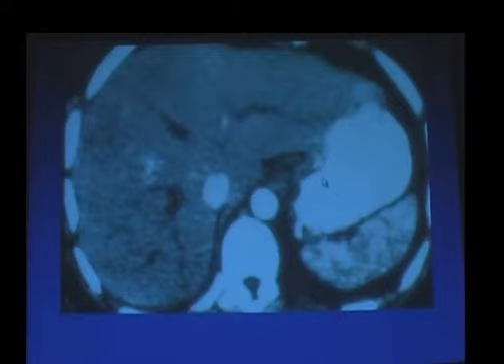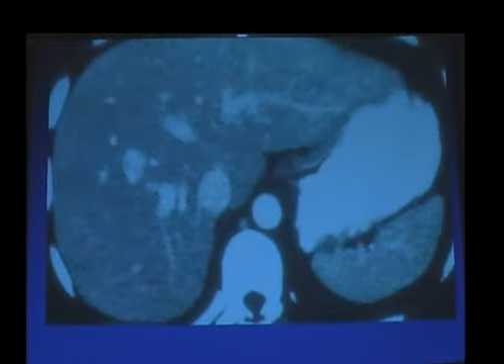But I show this because sometimes you have patients who have suffered trauma who come in and they have cardiac disease, and so you try and image during the portal phase, but because their cardiac output is decreased, you end up imaging a little bit too early during this phase of enhancement. And if that happens, just immediately go back and rescan the spleen so that you can scan during a more homogeneous portal venous phase.